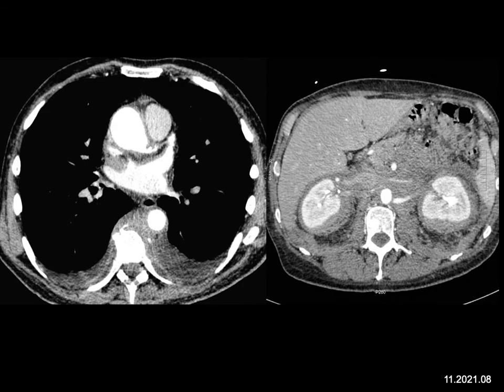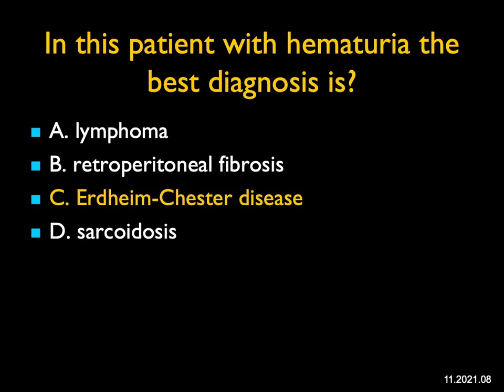One of the classic things is bilateral symmetric osteosclerosis of the metaphysis and diaphysis of the long bones, particularly the femur. Just a wonderful, wonderful diagnosis, and you really could help the patient by making that diagnosis, because often the clinician has never thought of that disease.